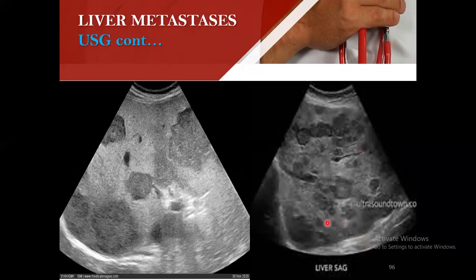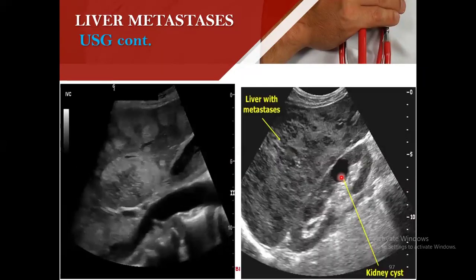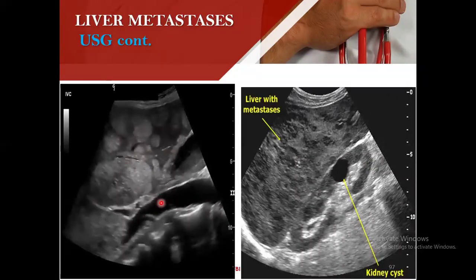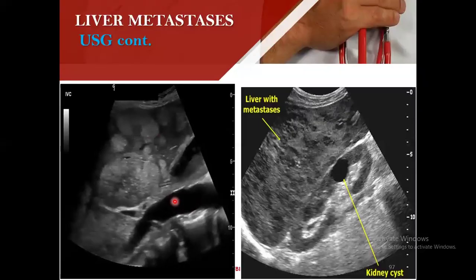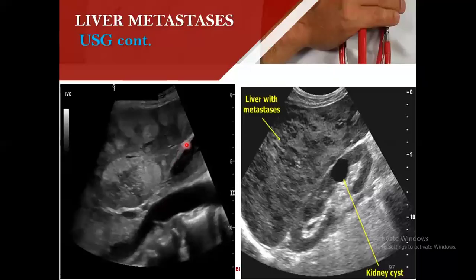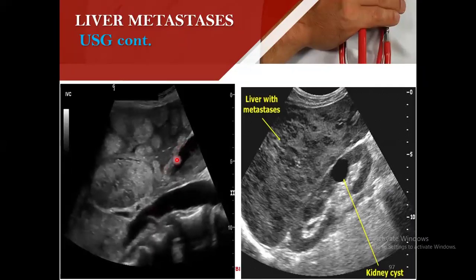So once one tumor forms in the liver, within 3 months, they are about 4. 6 months, they are about 7. 10 months, 1 year, 2 years, spreading like that, and subsequently fill the liver. So they spread like that and destroy the liver cells. So have you seen someone's liver? What is this structure here? Who can tell me?